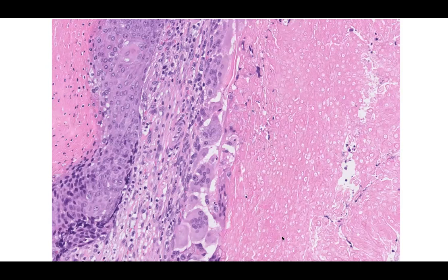How would you describe the cells on the left? How would you describe the cells in the middle? And how would you describe the cells on the far right?